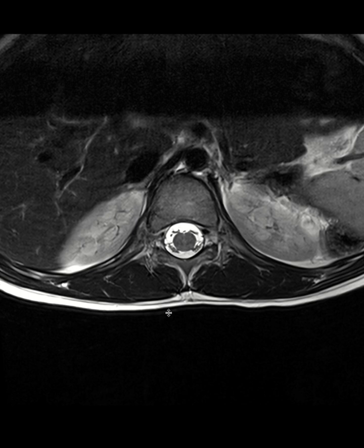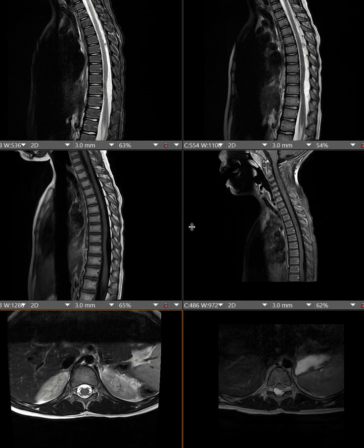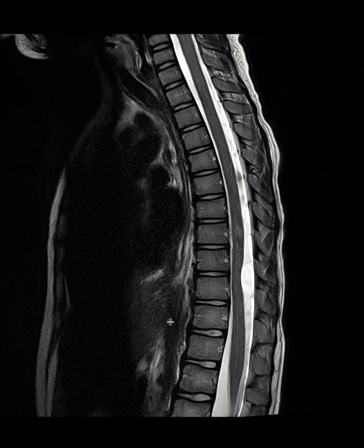When you see such an indentation, there are basically three differential diagnoses. We are dealing with either a thoracic web, a thoracic arachnoid cyst, or ventral cord herniation. This appearance is a very smooth indentation, and it looks like there is something here exerting mass effect. It was not enhancing. It's a very good look for an arachnoid cyst.